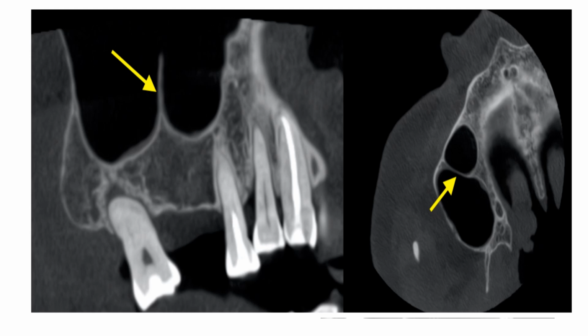Now the second one is the antral septation, septa within the maxillary sinus. This is seen in 44% of cases, whereas the pneumatization into the root of the teeth is seen in 83% of cases.